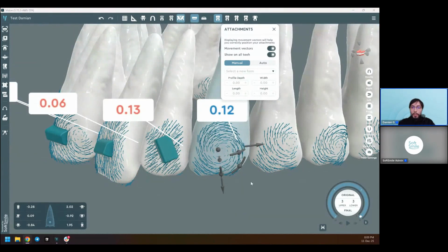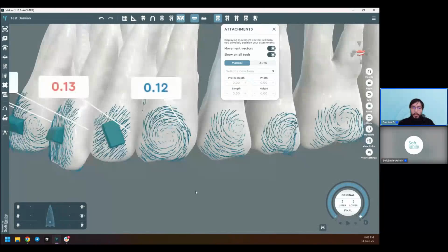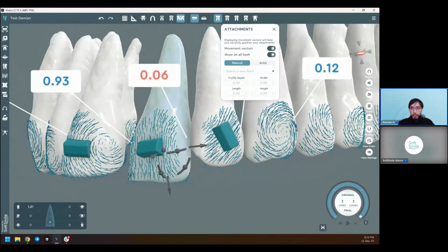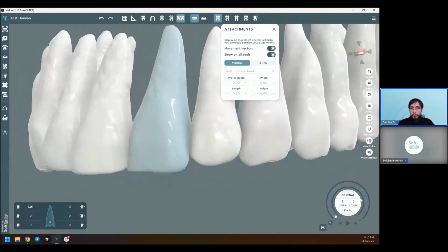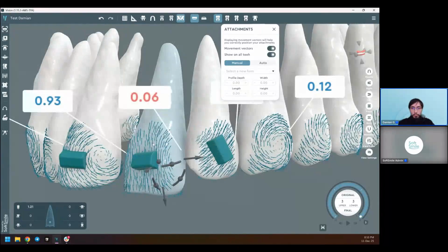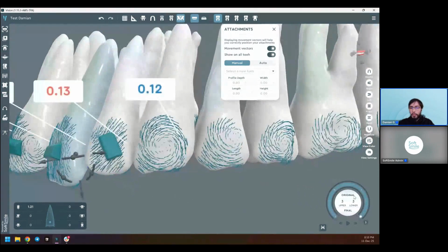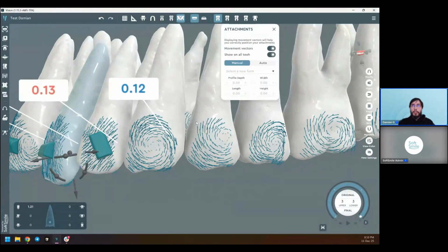We could talk a bit more about the shape. Like I mentioned, you'll notice that for the intrusion and extrusion movements for this tooth, it's a pure extrusion here for demo purposes, the arrows are more or less uniformly, unidirectionally pointing upwards. And for rotation movements here, we're seeing these interesting characteristic swirl patterns. This is not necessarily a universal rule, but this is typically what you'll see, these swirls on these types of movements.